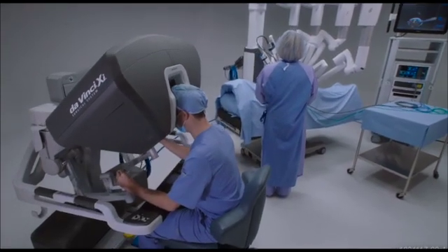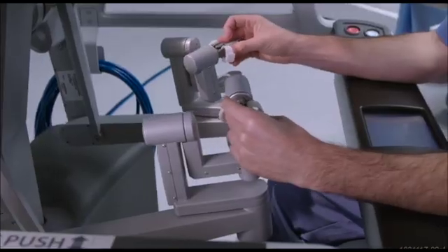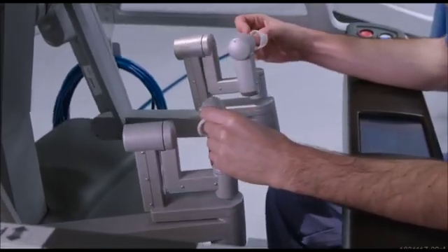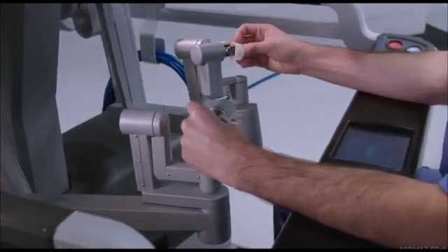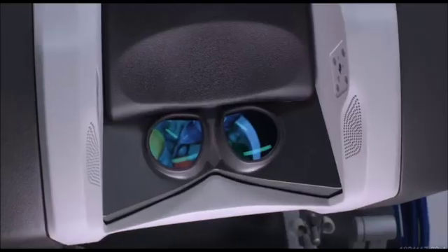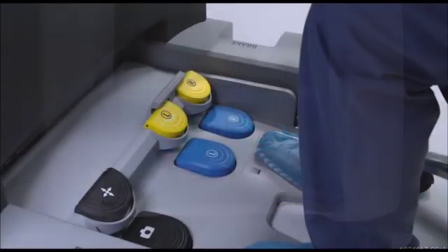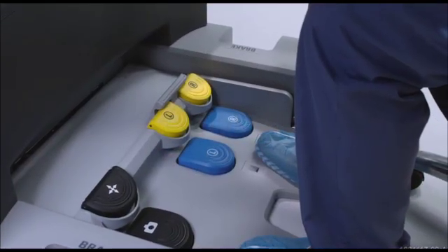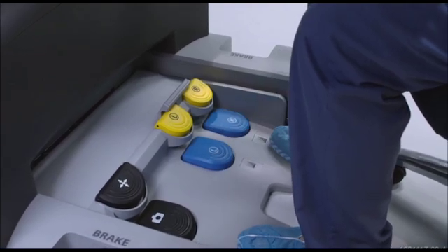The surgeon console is the component of the da Vinci surgical system which enables the surgeon to remotely control the EndoWrist instruments and endoscope via the hand controllers. It also provides a 3D HD view of the surgical field via its stereo viewer. The surgeon also controls energy application via the surgeon console foot switch pedals.